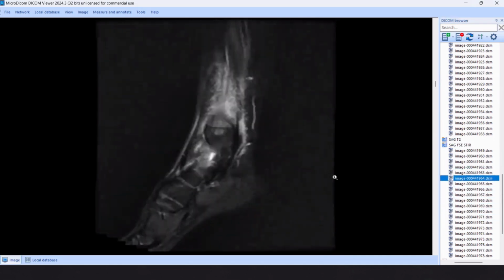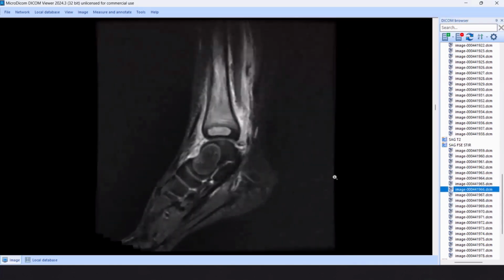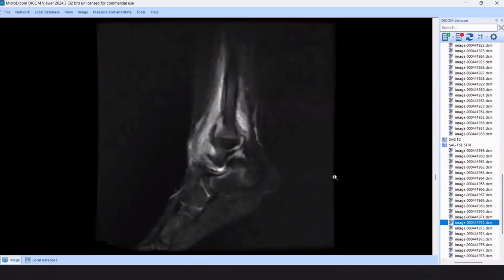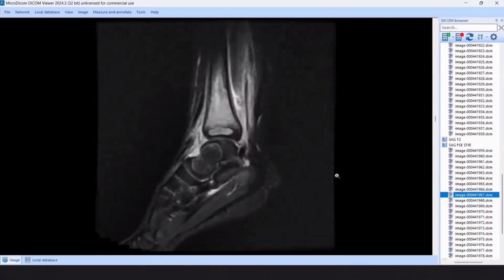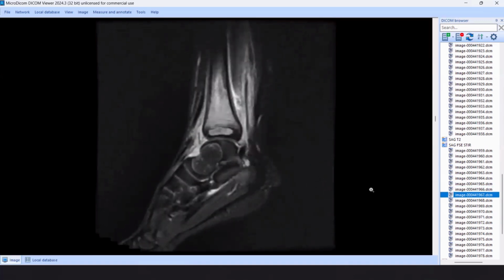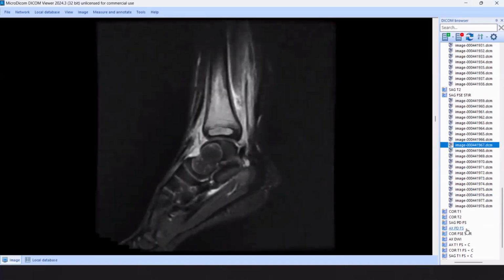Yes. Okay, and I agree with you that we have diffuse marrow edema involving the distal tibial shaft, metaphysis, and also epiphysis, and we have also this focal area of intense high signal seen in the epiphysis of the distal tibia. And also the periarticular musculature and soft tissues. Periarticular soft tissue edema as well. Okay, inflammatory changes. Yes.